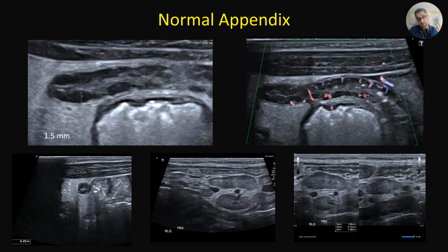So in lymphoid hyperplasia, we expect to see some hyperemia. There are no secondary signs. This is how we can differentiate it from appendicitis, but it's also tricky because there are lymph nodes. Lymph nodes are secondary signs. Hyperemia can be a secondary sign, but we can see it. Increased echogenicity: in this case, there is some increased echogenicity, but it's very diffuse, most likely related to the underlying pathology or just technical. It is uniform. It's not more pronounced around the appendix. So this should not be overcalled.